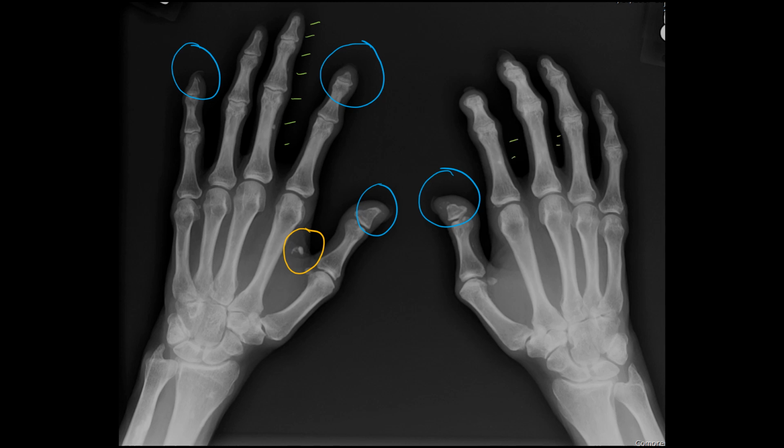So this is a patient with scleroderma, which is systemic fibrosis, and you get fibrosis all over the body, and you have findings in the GI system, in the chest, and also the MSK system. But that resorption of the soft tissue is related to fibrosis and the loss of vascularity, and the acrosteolysis is similar to the pathophysiology of frostbite, although obviously not the same. But when you put together the calcification, the soft tissue resorption around the bones, and also acrosteolysis, you have to think about scleroderma.